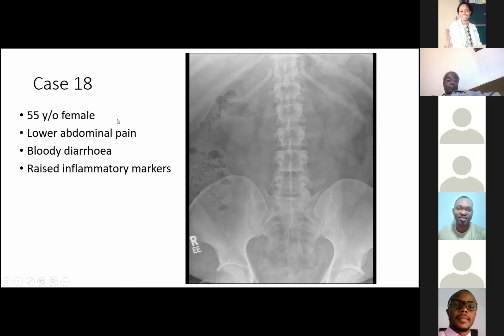That there's maybe feces in the ascending colon on the right, but I think that when it gets towards the transverse colon, it's not as clear. The bowel lumen is not as clear. I think that there's some edema of the bowel as well, particularly the transverse colon, and I can't seem to make out the descending colon. But the lumen looks small to me once it gets towards the transverse colon. And then yeah, the edema.